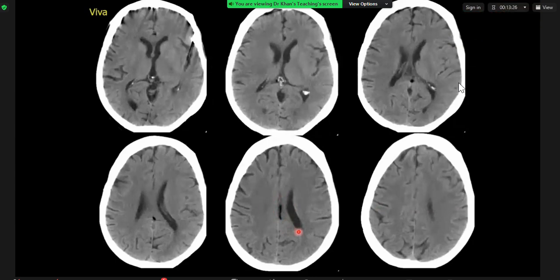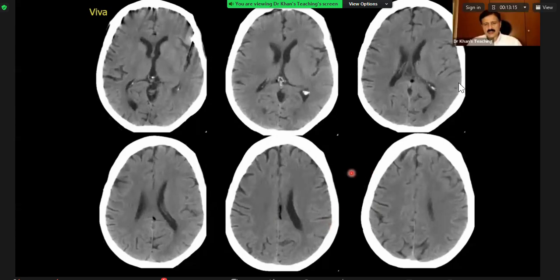So it's a midline fat density area. Just looking at that, it could be a lipoma of the corpus callosum. Excellent. The idea here is to develop your eyes on an axial slice. How will a lipoma of the corpus callosum look?